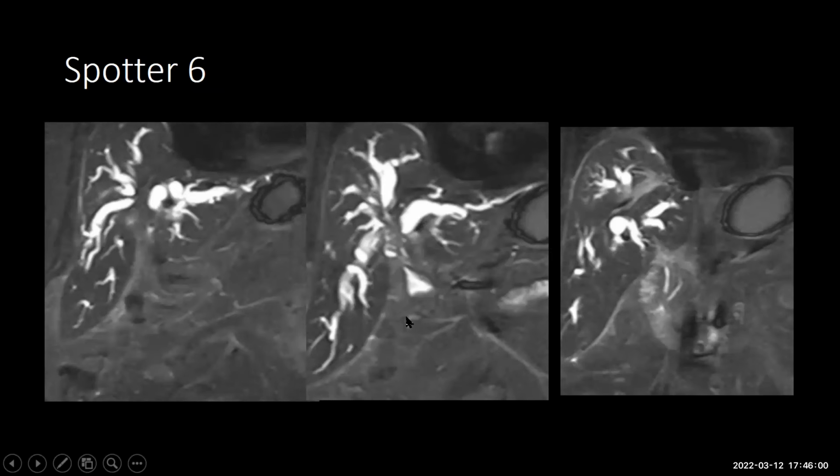Is there anything else that you want to see? I agree with you. There is bilobar intrahepatic biliary radical dilatation. So that's right. This is a classical one. What is this classical? This is a classic called as a hilar cholangiocarcinoma, or Klatskin tumor, where you are seeing a mass, and this is the CBD. As you correctly said, the CBD is not dilated.